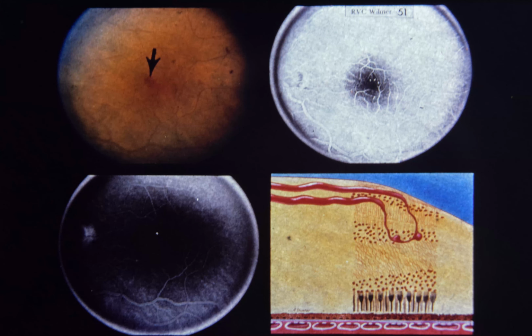Slide 51. Telangiectasis without exudate or edema. This 56-year-old white male was found to have microaneurysms at the posterior pole of the left eye on routine ophthalmic examination. Visual acuity was 20/20 in each eye. He did not have diabetes mellitus, hypertension, or other systemic disease. Positive findings were limited to the left macula.